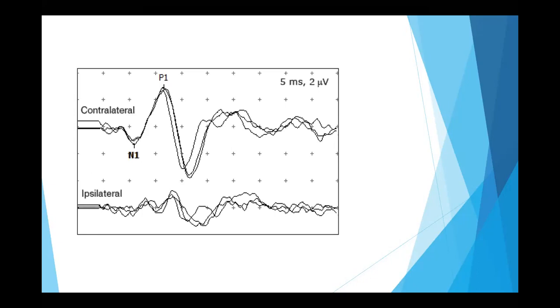Okay, so what we have here are the OVEMP responses. The lower one is the ipsilateral response. As we said, OVEMP is a contralateral response, not an ipsilateral response. So you have not recorded anything, or only a small change. If you look here, you have a small change, which is not clinically significant. So we don't use that anymore. We are concerned about the contralateral side recordings.